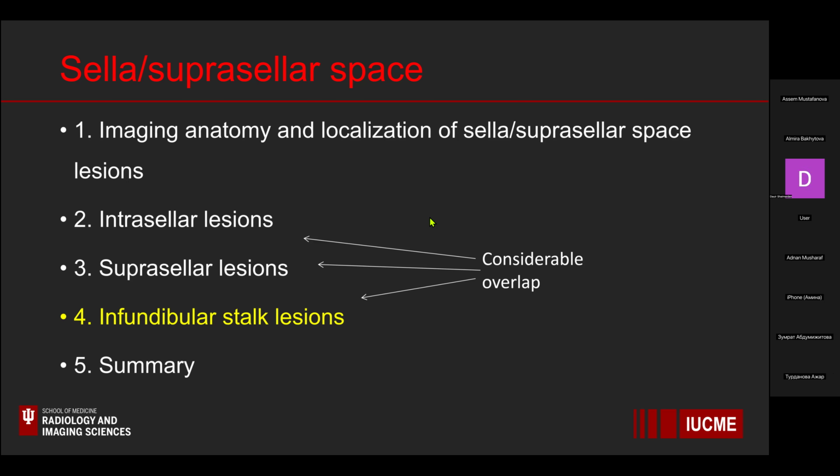I also have a question from my side about perfusion. How do you think these advanced methods are not so useful for this localization, right? That is correct, and it's partly because of where this lesion is. You're very close to the skull base and very close to the aerated sphenoid sinus.